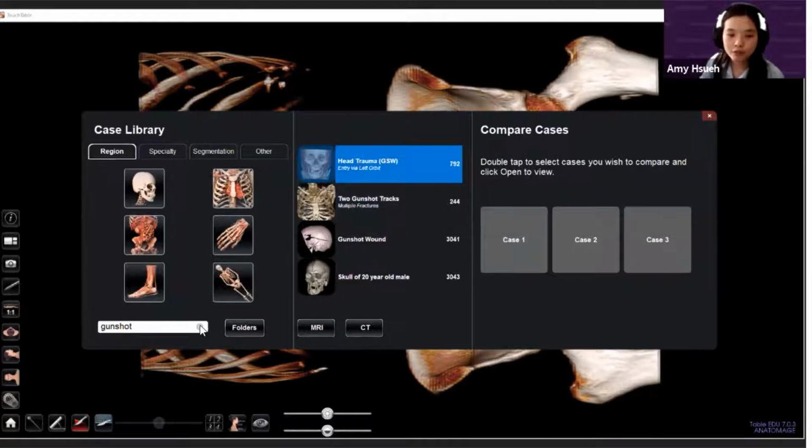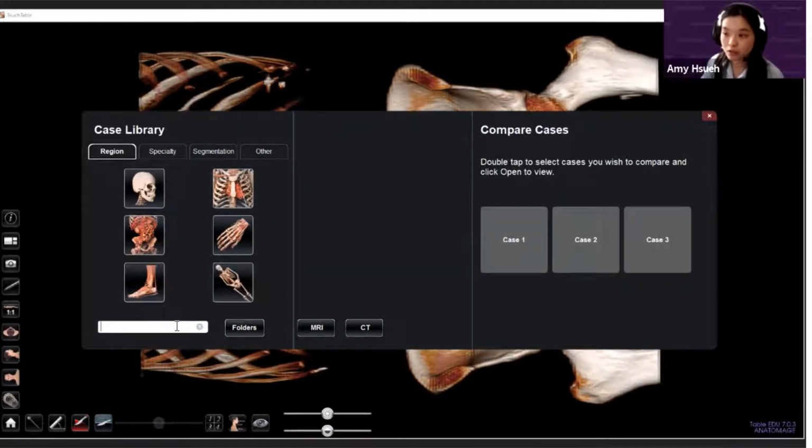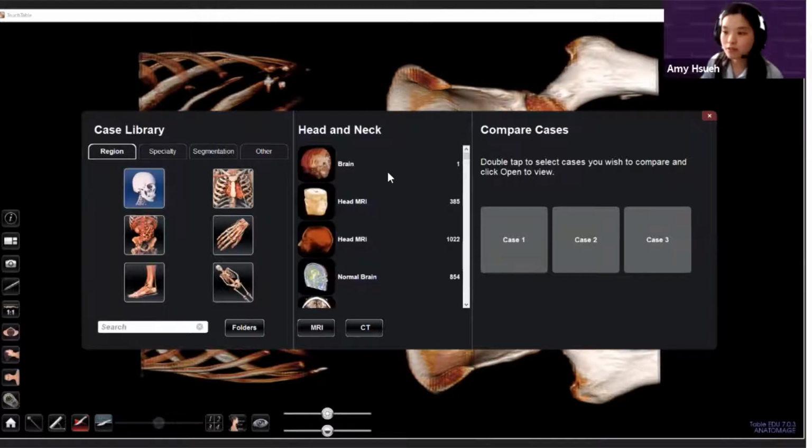With every single table on the desktop, there should be a case library list and a case library description PDF file. The case library list will be literally a full list of the case numbers and titles of each of the cases in our case library. And the case description PDF will have the description of each of these cases located on it.